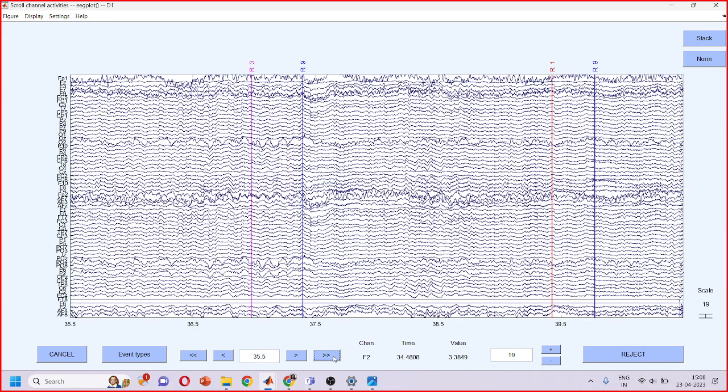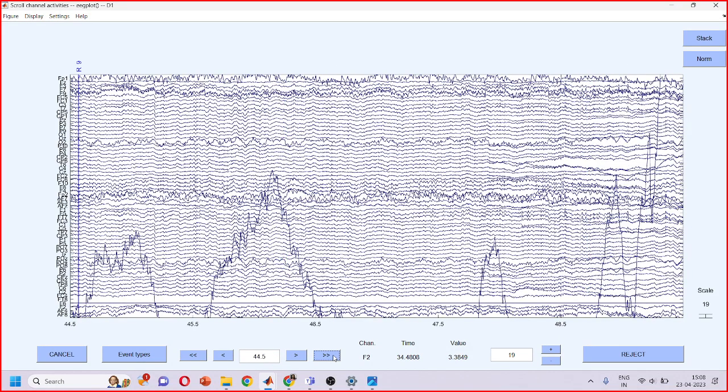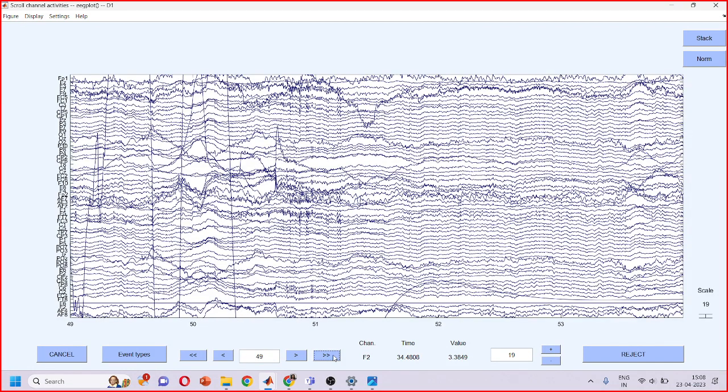So basically, in other major frequency type of studies, it's important to look at each segment of the data, because then you will be using continuous data, and here you will be using segmented data. So it's okay to first filter it and then clean it manually. Anyways, the data looks good. Some segments are bad. We can come back to them later.